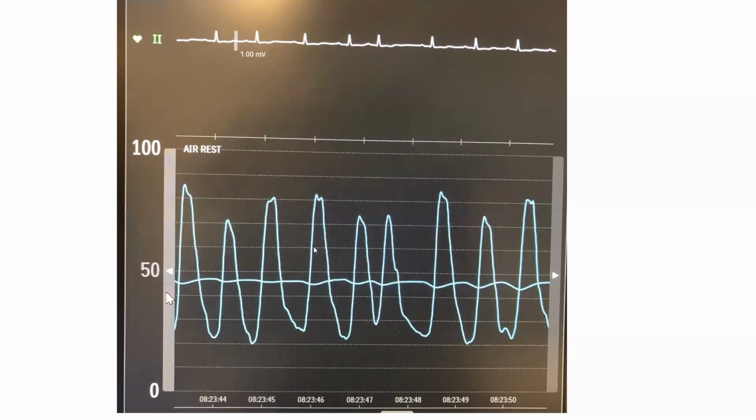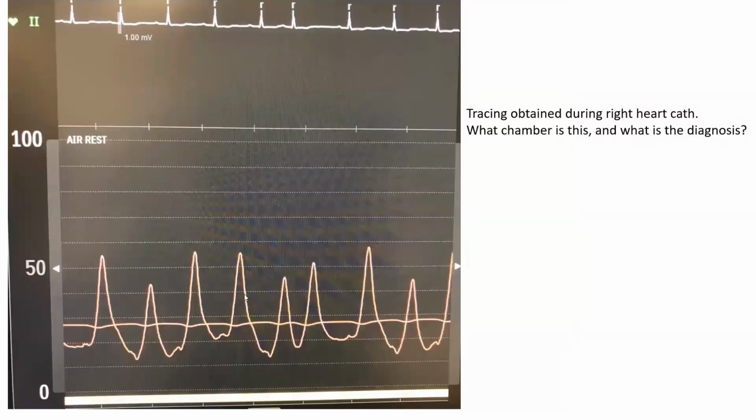You see that? Also the timing. If you time it, one, the morphology, it's plateaued, not peaky. Two, it's peaking in the STT segment, in the T wave specifically, whereas this one peaks after T wave.